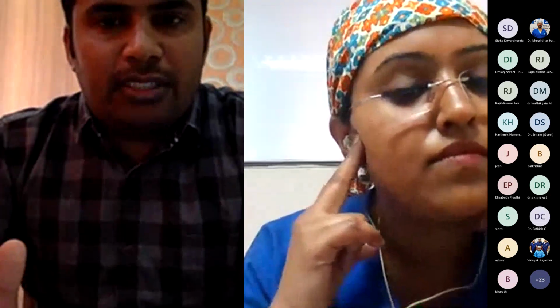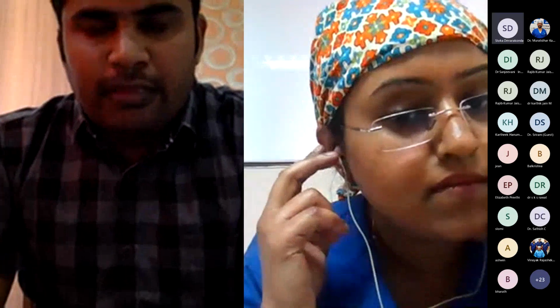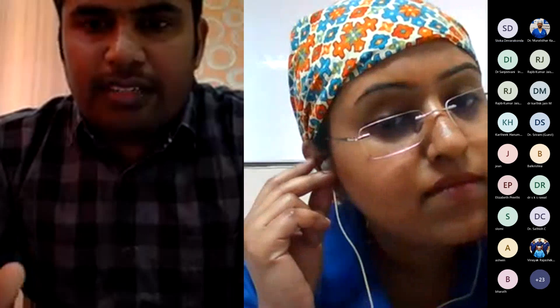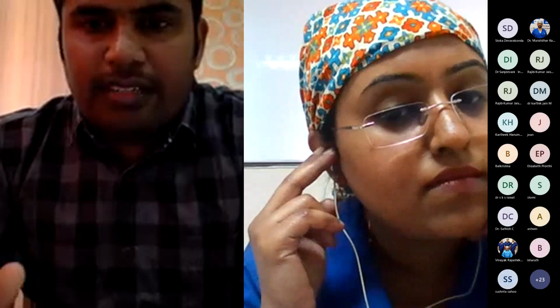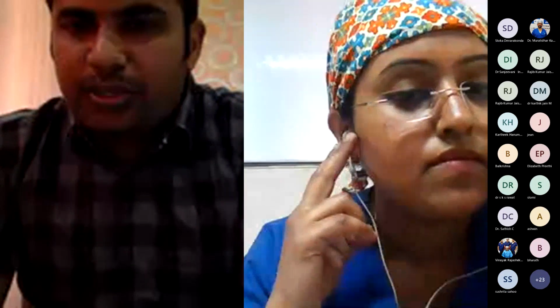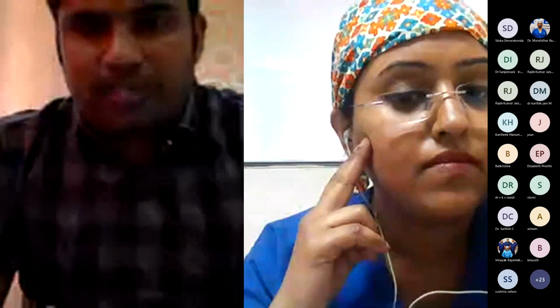But ideally, it is better to measure in the mid-esophageal view. This is my belief, I think. Because whenever I tried for 2D images in the deep transgastric, the quality is not so good, and we are not able to measure. So I don't think we should comment on that.